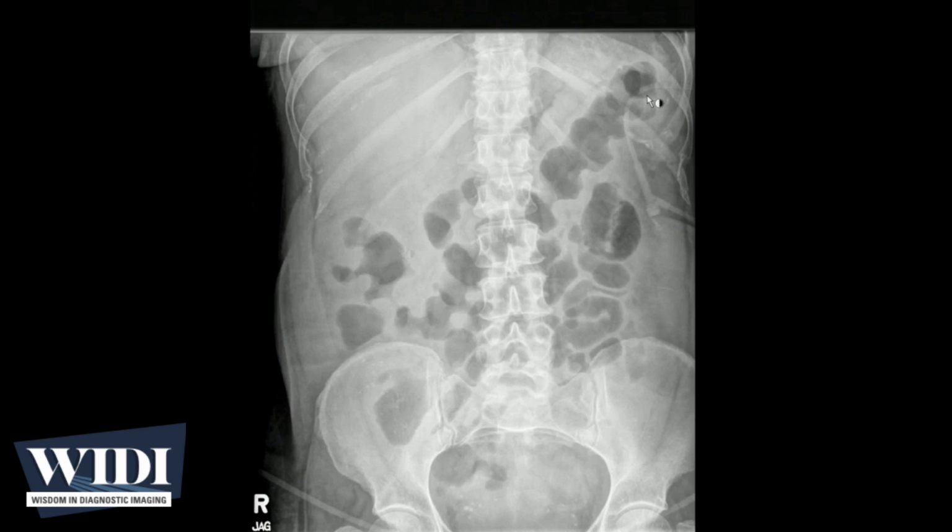Any of those three things could potentially be causing this finding, and you want to make sure that you notify the emergency room physician, because this is an acuity priority, and you need to let the doctor know that the patient has colonic edema and they may need additional imaging to further characterize it.